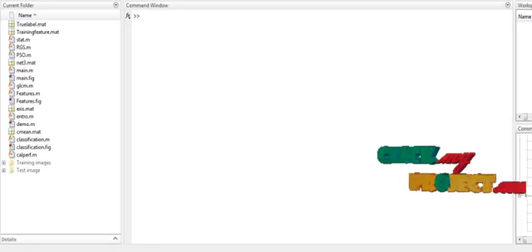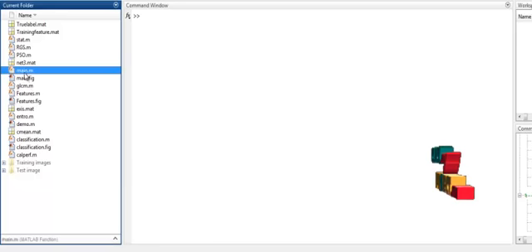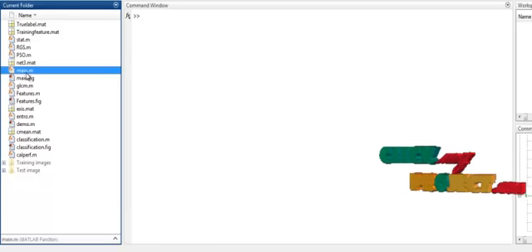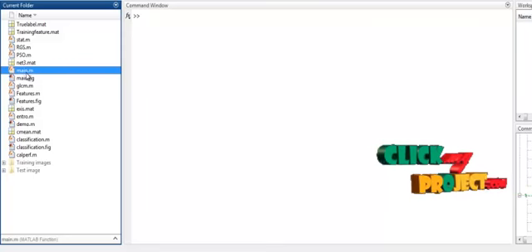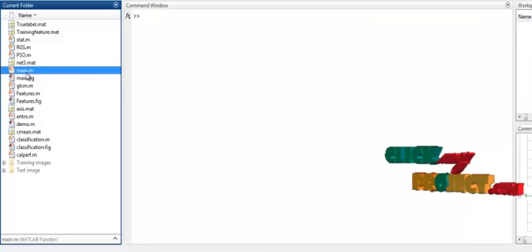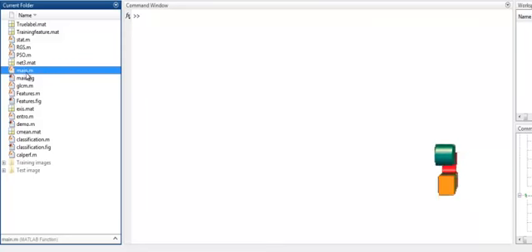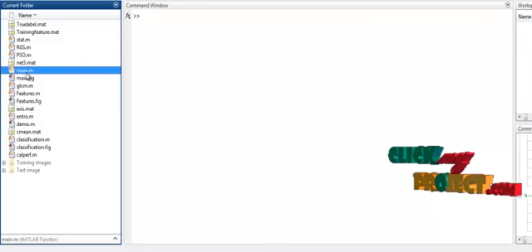Let us see the running procedure of the process. So if you want to run the code, select the file main.m, which is located in the source code folder. The process has been developed in MATLAB 2013 version. So run the code in 2013 version. In other versions, errors may show. So run the code in 2013 version alone.